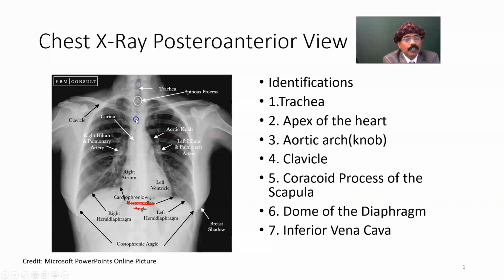The trachea is a midline structure, maybe a bit right-sided due to crossing by some structure like the arch of the aorta. The trachea may be deviated in case of pneumothorax, atelectasis, collection of fluid, or some adhesion, and some type of cancer may also push it.